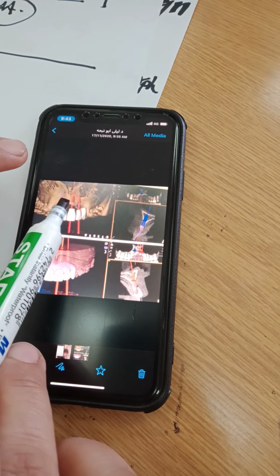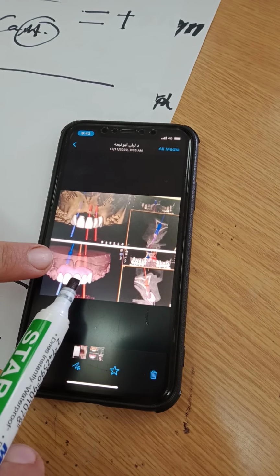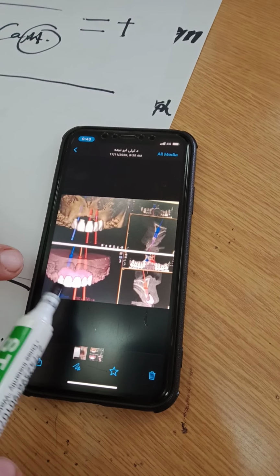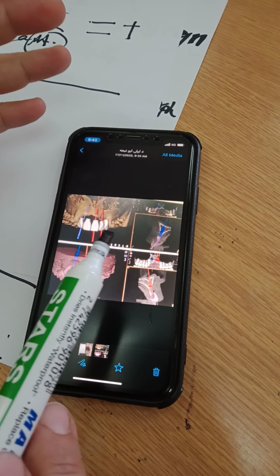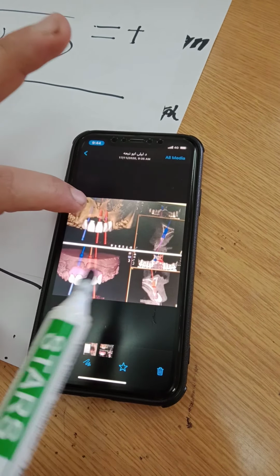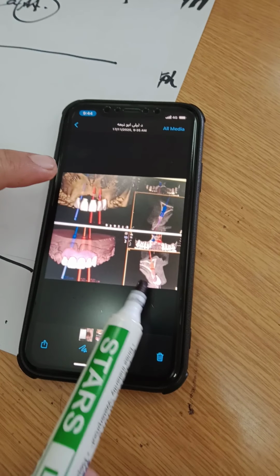Maybe they found that there is a lot of bone that needs to be added. Maybe this is limited in surgical procedures, so they went for another design. So no, it doesn't work with implants. So we have to go for bridges and porcelain coverage of the graft area, because we cannot graft this amount of bone. Maybe in their limited facilities, maybe other facilities have better augmentation procedures. But the idea here is that look how the 2D smile design is overlapped over the CBCT, and it's guiding the planning.